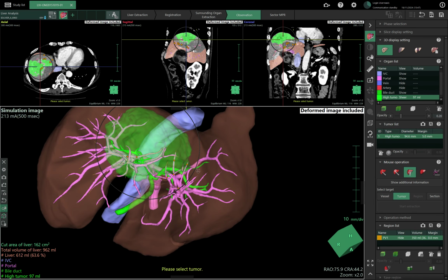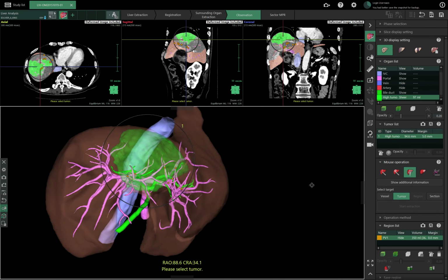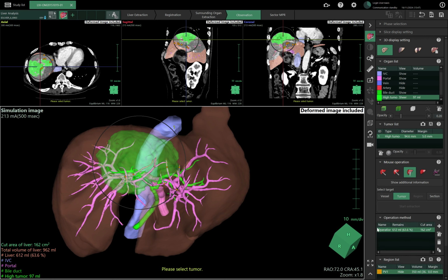Anyway, this is more of the appearance that the doctors will look for to make that kind of segmentation. But still, they want to combine this with another, as happened with the lung resection.